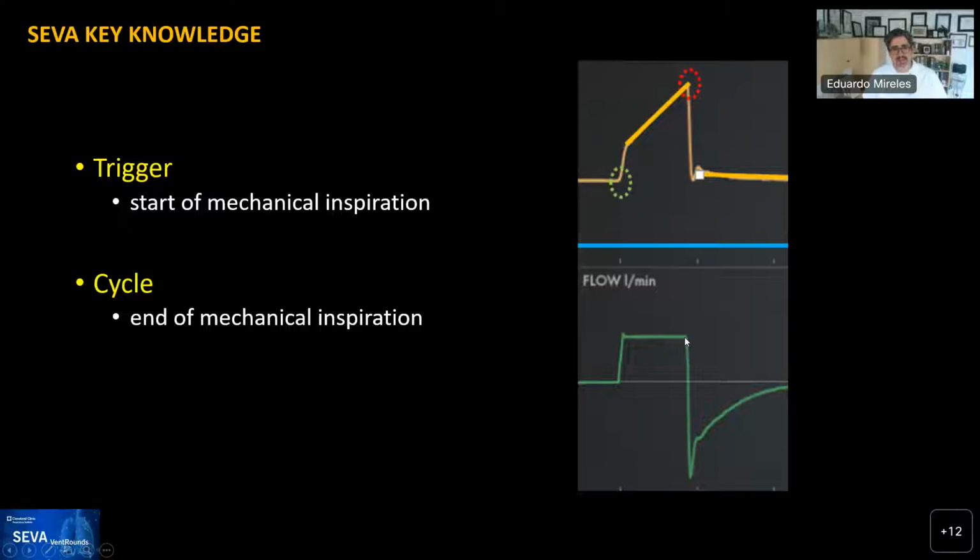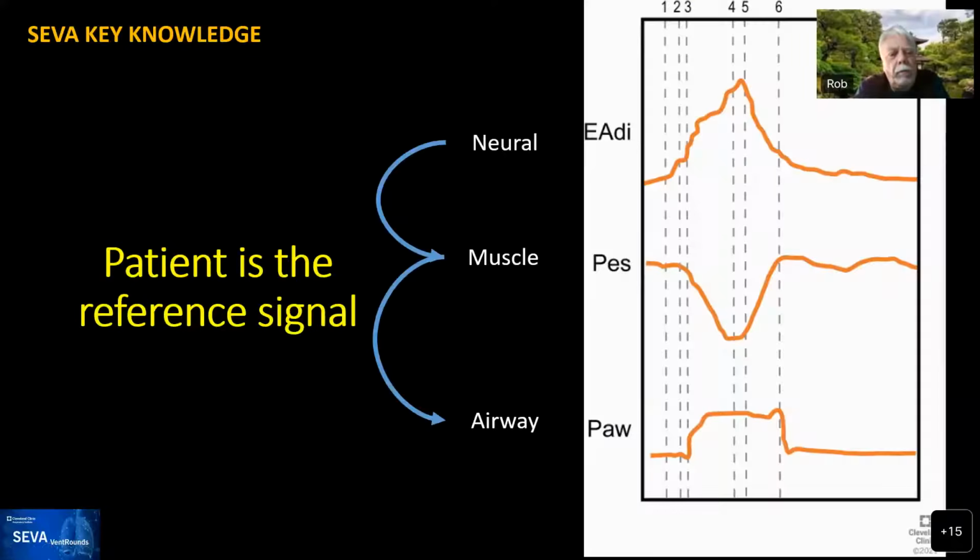And finally, if we don't have any of these three, we can use an airway signal, and that's what usually we do. We have on all the patients that you can see the airway signals, either on pressure or on the flow, to recognize the presence of muscle activity.